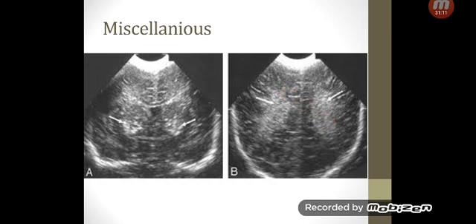Basically what's happening here is that this baby has a metabolic disease, which is affecting the midbrains on both sides. So in this specific patient, and it happens to be the same finding as the patient that I had, and because I was querying that, that's why I looked it up. He had Leigh disease.